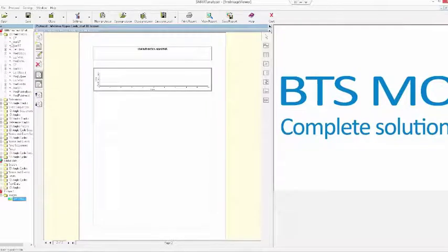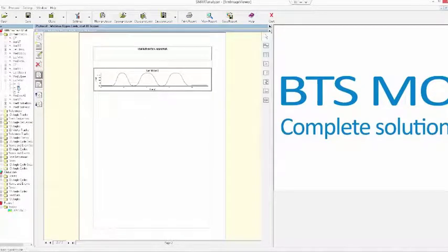To add a graph in the data panel, we have to choose the variable that we want to show. For example, I want to choose a 3D trajectory that is below this menu. Okay, so for example, let me add the lateral wrist, so I can choose a component, for example, the vertical component. As you can see, to add the graph, we just have to drag and drop the desired variable into the box. Okay, so that is the graph. In this case, we have a plot of the vertical component of the lateral wrist marker in time.